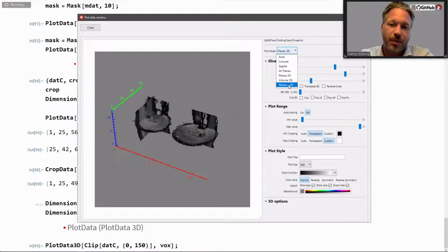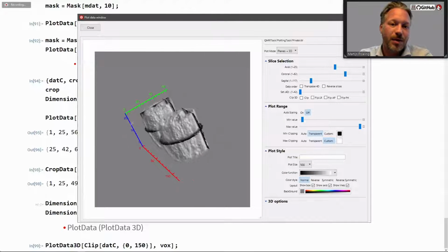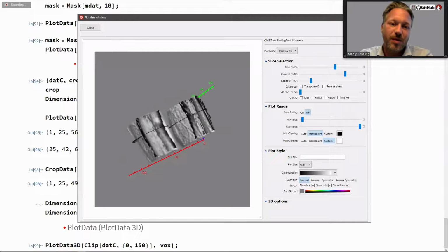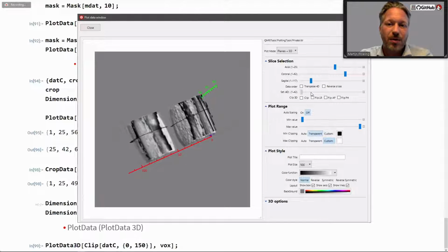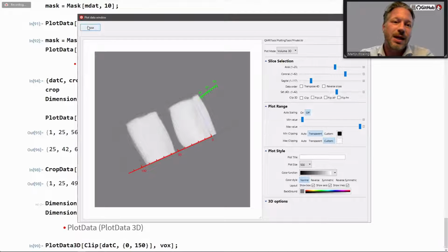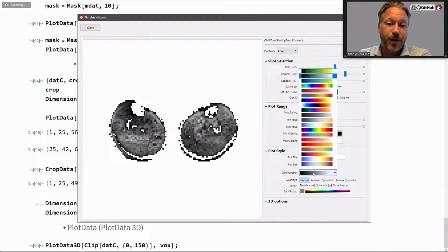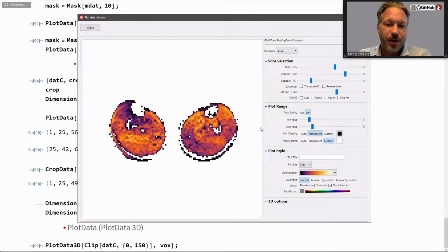And of course, Image3D also allows you to render the volume, but now it becomes a bit sluggish. So there's still something I have to optimize, especially once you want to scroll through the volumes while Image3D is there, it's not really performing that well yet. But I think visualizing data is really important because you really need to see what kind of data you're working with. So there's a lot of different ways to visualize the data in my toolkit. You can change colors, you can do a lot of cool stuff with that.